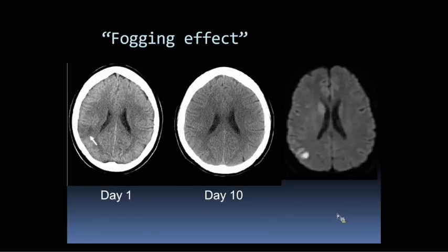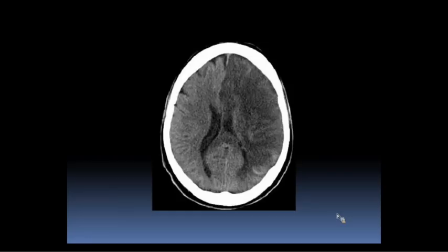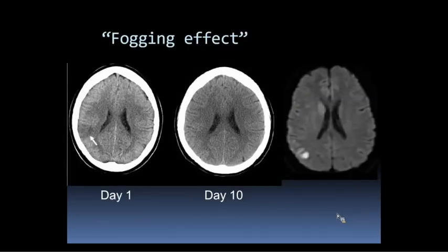So something that can really throw people off here, but it's a very interesting phenomenon, and we see it all the time. If you get your first CT at day 9, 10, you tend to say there's no stroke. Yes, and then it could really be one. So a patient comes in and says, a few days ago I had some of these symptoms, you get a CT scan that is negative, but that doesn't necessarily mean that the patient didn't have a stroke.